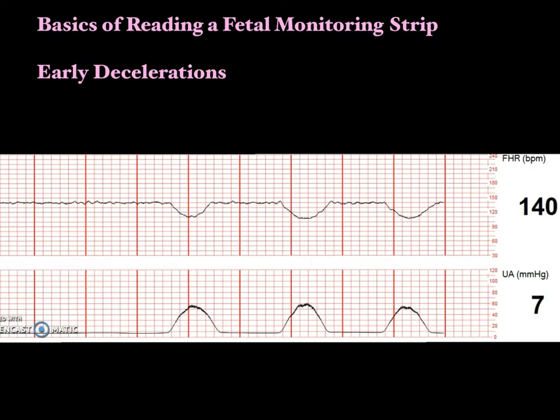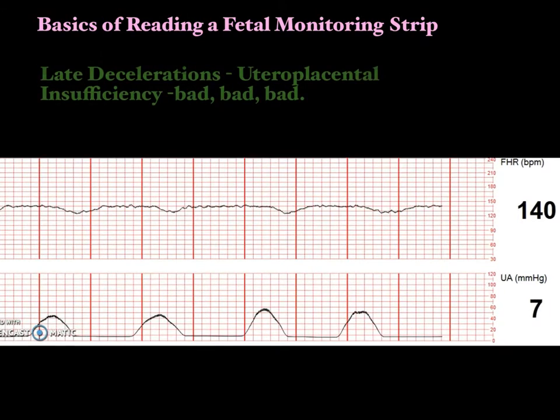That would be a bad sign in that sense, but it's not a sign that the baby's in any kind of trouble in itself. Again, I've left you some minimal variability there. We're going to say the baby's sleeping, only because I want you to see the periodic and episodic changes a little bit more clearly. If I have moderate variability in there, it's going to be a little bit tougher to see.